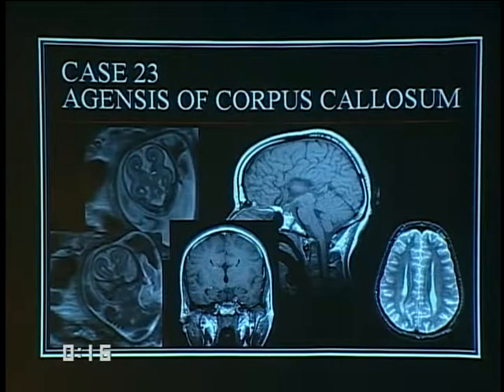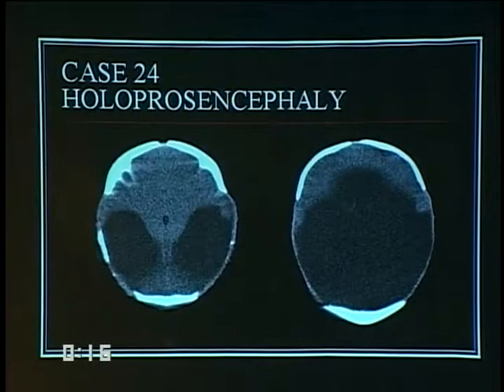And so you have this large space that's abnormal. In this child with holoprosencephaly, there's not normal cleavage of the cerebral hemispheres. Pathologically, although this looks like frontal lobes and everything else is absent, really what's absent here is the frontal lobes. Histologically, this tissue looks more like parietal and occipital lobes.